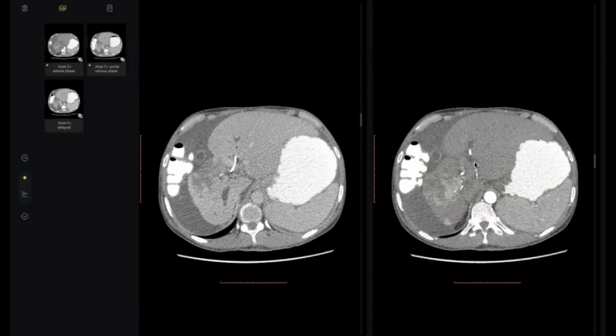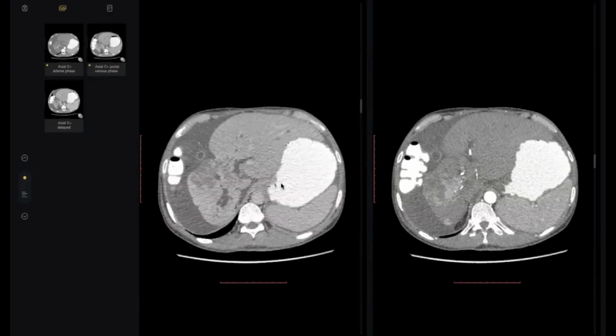I would like to check also. You should see this is arterial phase hyperenhancement. Hyperdense in non-contrast? No, hyperenhancing. This hyperenhancement part shows what? Washout in the portovenous phase. Excellent. We are talking about a malignant lesion.